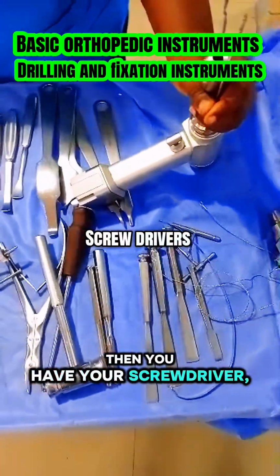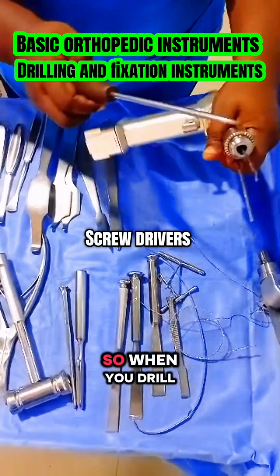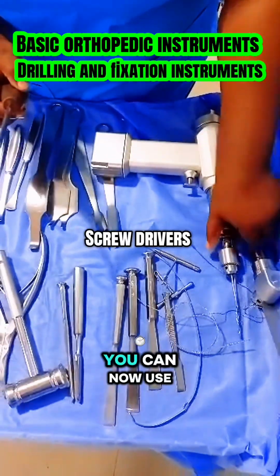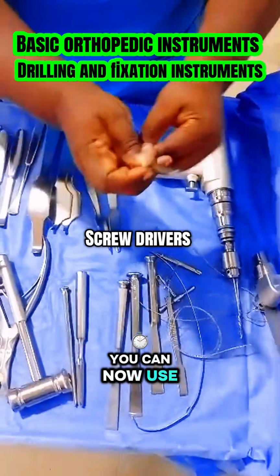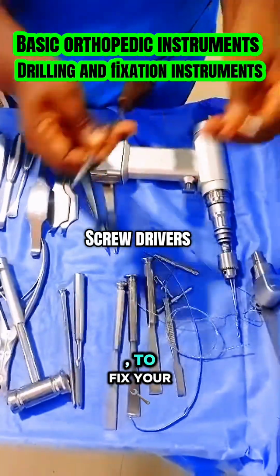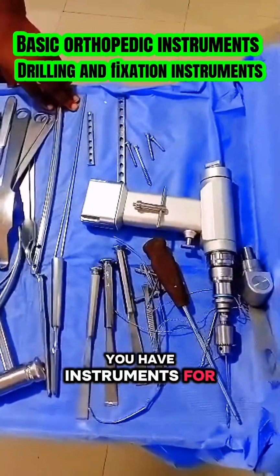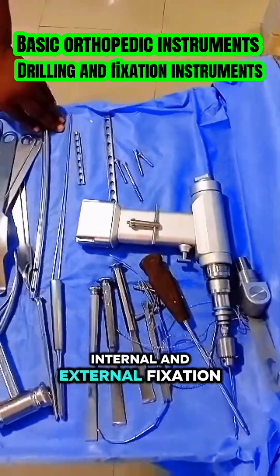Then you have your screwdriver. So when you drill, you can now use this screwdriver to fix your screws. So this is the screwdriver. You have instruments for internal or external fixation.